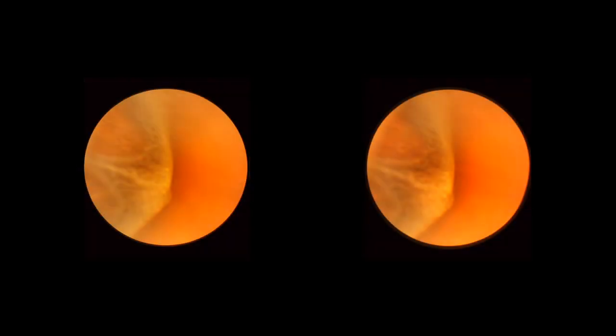This is the eye of a 53-year-old woman with a small elevated cystic area of the peripheral retina at the posterior end of a meridional fold. This 30-year-old man sustained a severe blow to his brow region which resulted in a variety of injuries, including hyphema and vitreous and retinal hemorrhages. This photograph shows a retinal lesion which is either a tiny area of elevated full-thickness retina or a traumatic retinal cyst.